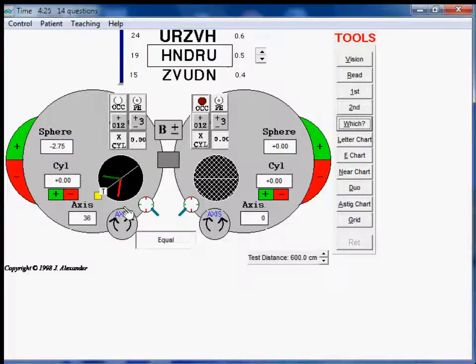They're equal. So what you need to know is that there is a range that they could be equal. For example, we go to 35, first, second, switch. So they're both the same for these as well. So it's around 35, 36.